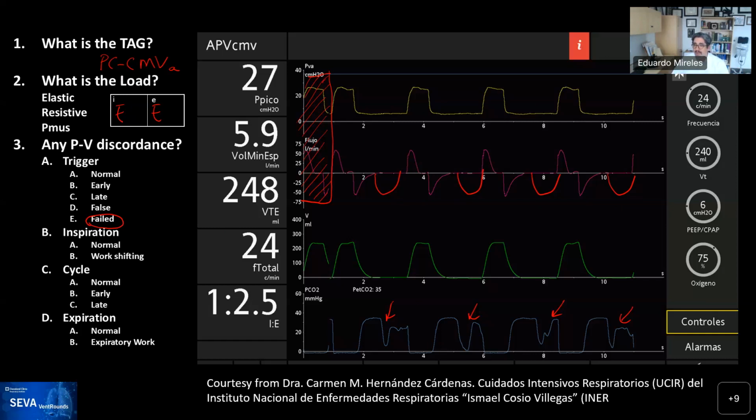I see a comment from Ariel that says the capnogram is very sensitive to reversals in flow, and they can be observed from far away compared to the other graphs. Thank you, Ariel. Yeah, the scale also has to do with this, right? The changes in CO2 on the scale are larger when you reverse the flow than anywhere else. Rob? It's good. Isn't that a super exciting waveform? Yeah, it's really neat.